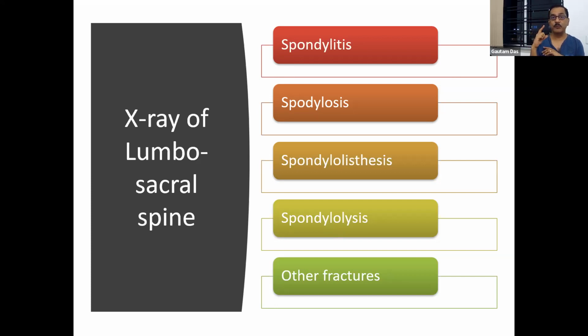The vertebral body in the lateral view is not exactly square; there is a curve in the anterior margin. But in spondyloarthritis or spondylitis, it will look like a square. There might also be other changes, like calcification of the anterior longitudinal ligament. These are the early changes, and the late change is bamboo spine. So this can be diagnosed on X-rays.